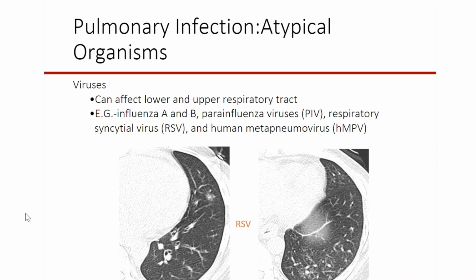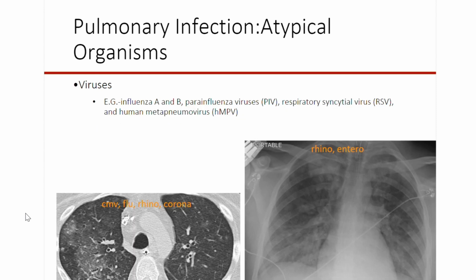And I said, all I see is this little bit of tree and bud and this one ground glass nodule. And he goes, you don't understand. I can't talk. I can't move without coughing. And we know that the virus is all in the tracheobronchial tree. That's where the infection really is. This is the little bit of stuff that we're seeing in the more peripheral lungs. But this poor man, he basically just could not function, and he was riddled with RSV infection.